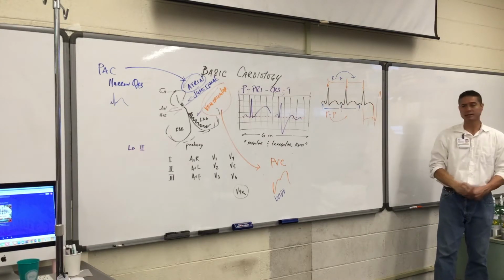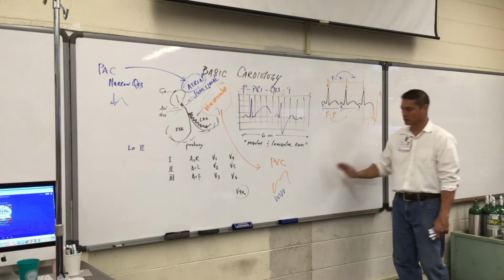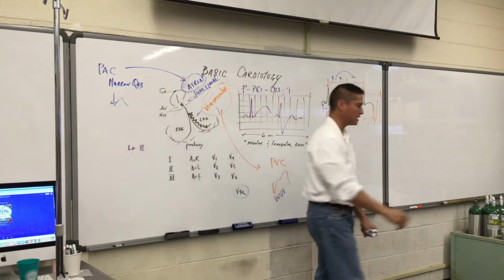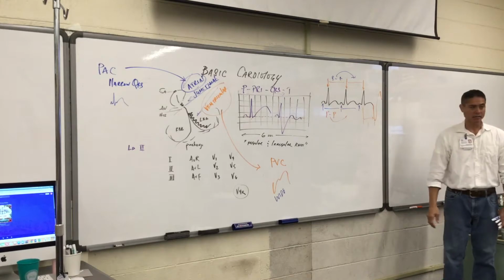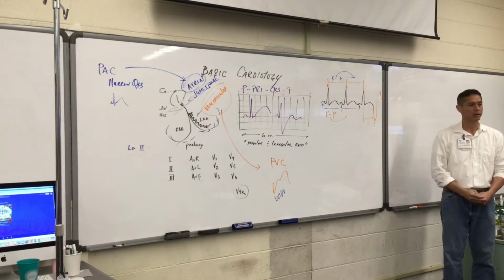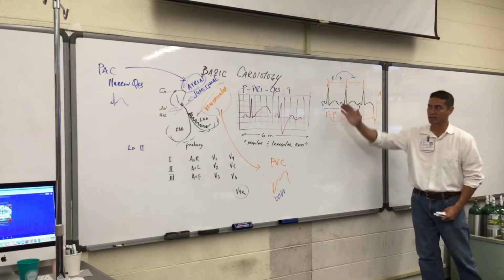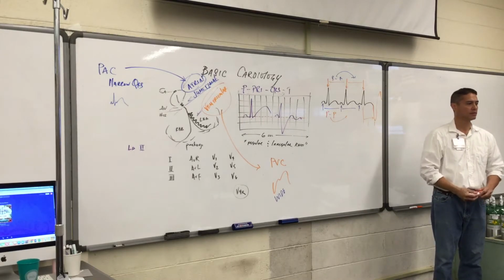The only weird thing is when we're looking at these, we may have an early beat, either ventricular, which is wide, that's depicted here, or a narrow complex that originated in the atria. It's sometimes a normal variant, or it may be contributing to a medical condition that they're suffering from. So when we're looking at this, we want to be able to identify it and bring it up to our LS provider.